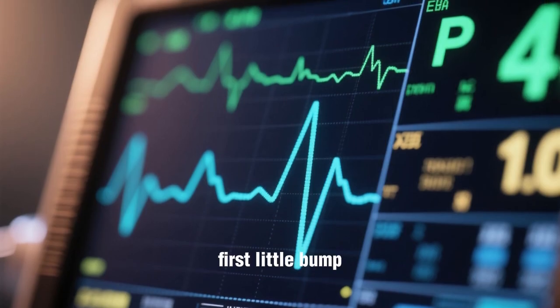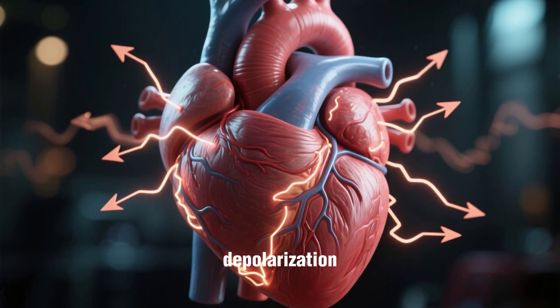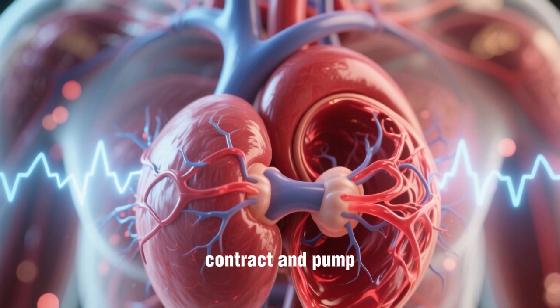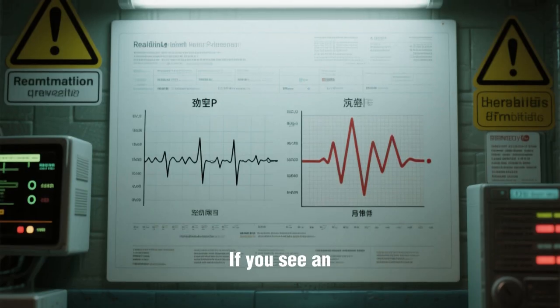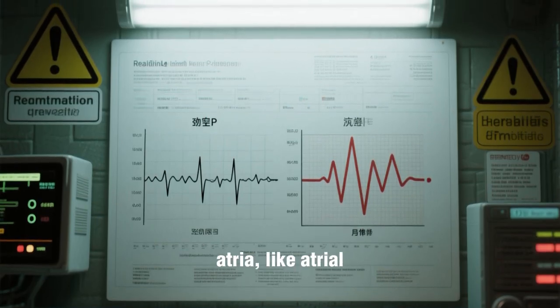The P wave is the first little bump you see. This represents atrial depolarization. In simple terms, it's the electrical signal that causes the atria, the two upper chambers of the heart, to contract and pump blood into the ventricles. A normal P wave is small, rounded, and upright. If you see an abnormal P wave, it could suggest a problem with the atria, like atrial enlargement.